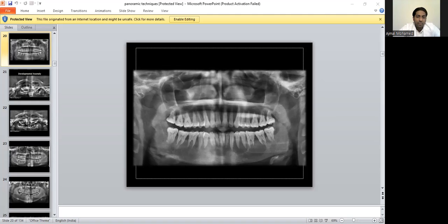The first rotation will be from the contralateral first premolar in the posterior region, then the same on the other posterior segment, and one from canine to canine in the anterior region. Nowadays, most dental panoramic equipment uses the moving type of rotation center because it conforms to the elliptical shape of the dental arches.